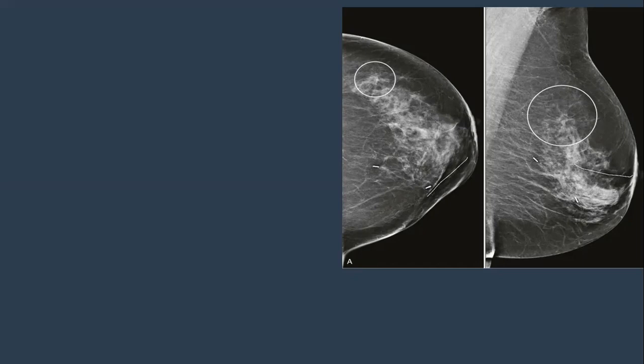Someone said biopsy. Who said biopsy? Me, Medina. Why biopsy, Medina? Because this is a true architectural distortion, maybe a different entity from the previous one. Why is it different from the previous? Because it's very far away from the area of intervention.